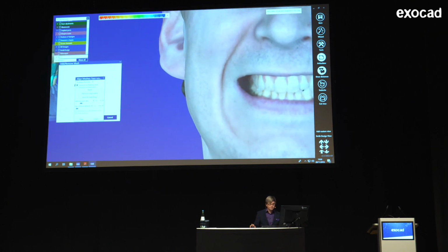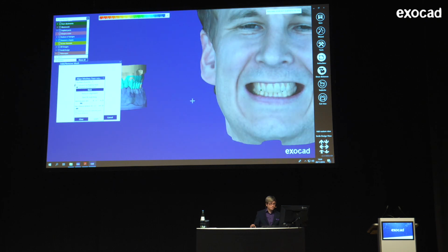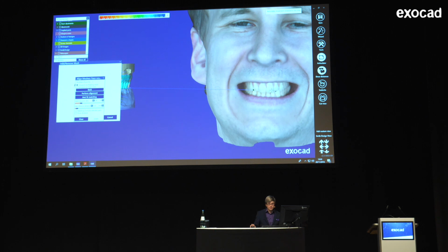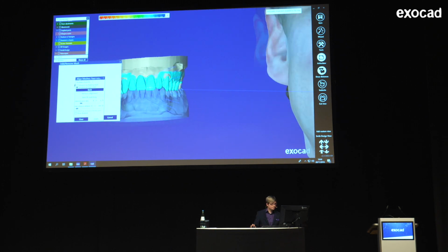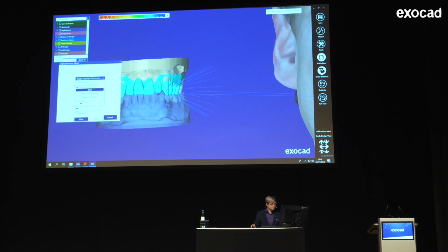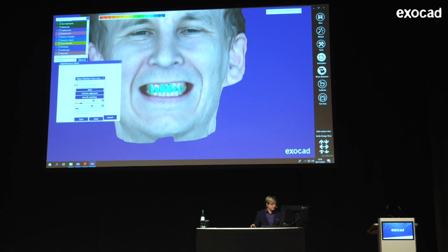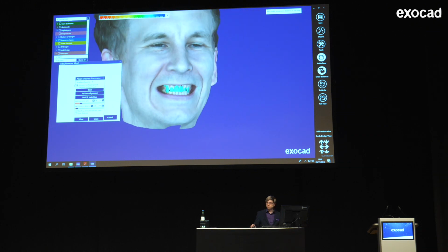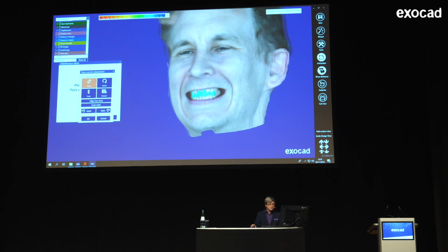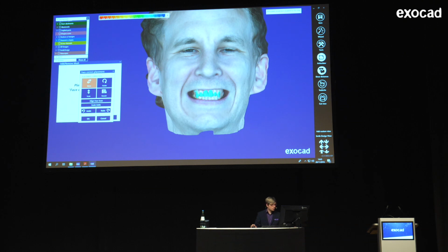But the trick for this is not to design one line of points for this, like you would maybe do, just take the incisal edges here, but actually create kind of a triangle of points. So I'm performing the alignment, and it looks OK. And I can actually have another option, the face correct placement, where I can move the face scan around, scale it, rotate it. I'm not going to do it because the alignment looks OK for me.